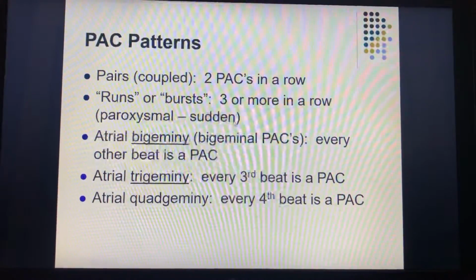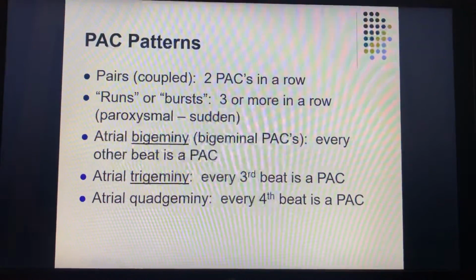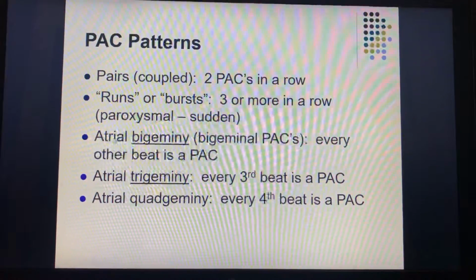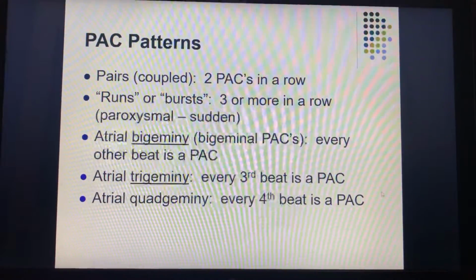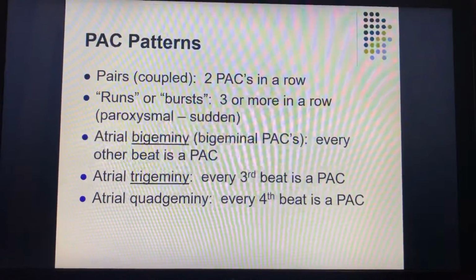Okay, your PAC patterns. Atrial bigeminy is every other beat is a PAC. Atrial trigeminy is every third beat is a PAC. Okay, you need to know those.